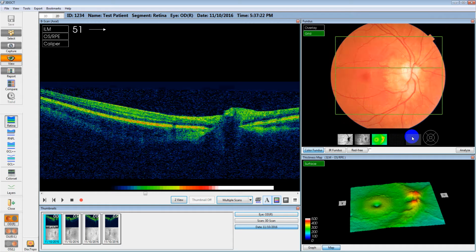And then you have a grid there too. So basically you can take this one and do a circle, and you can move this one around, and you can see the numbers change as you move it around on that grid.